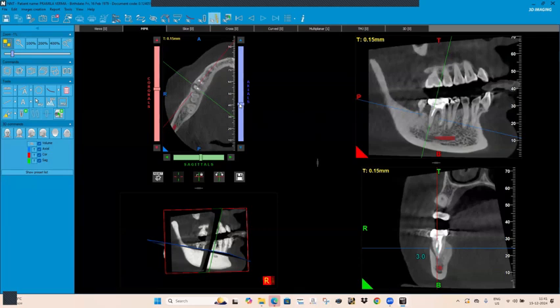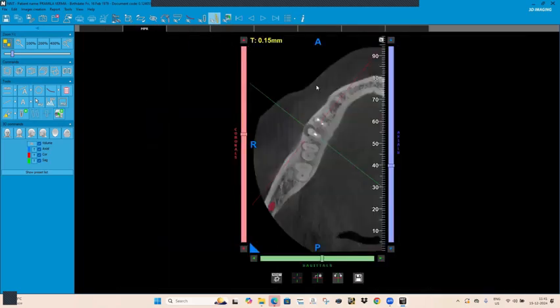So we get some blackish lines, and sometimes it becomes difficult for us to diagnose, especially if there is secondary caries. Sometimes even the radiopacities in the canals make it difficult to diagnose any radiolucencies. But that happens because we have to trace it in all three sections.